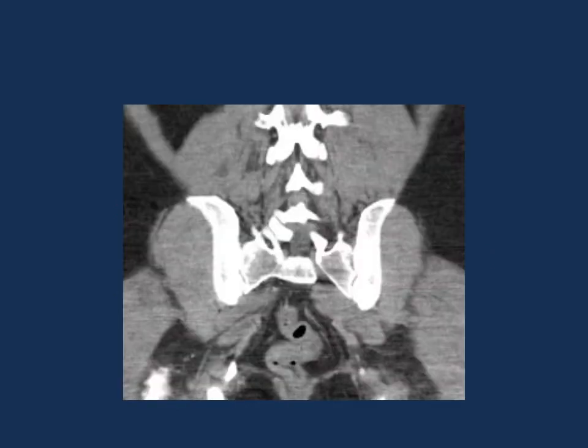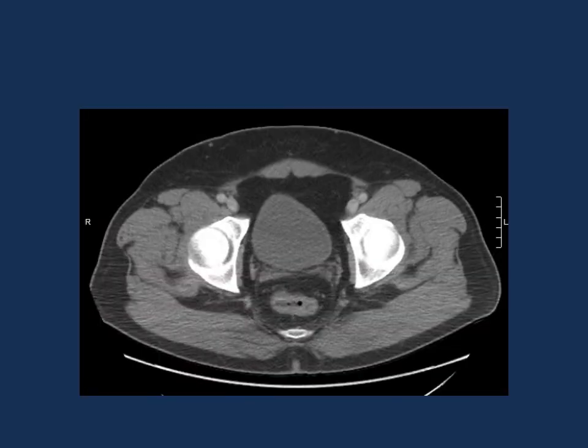Okay, great, Arya. So now we're down in the pelvis, and you can see the rectum and the anus, right, as you go further down. And you can see the sphincter complex, which is really cool. The levator ani, and then if you follow that down, is the puborectalis and the anus. So axial view. Yeah, on the axial view here, we can see the bladder. The bladder there.